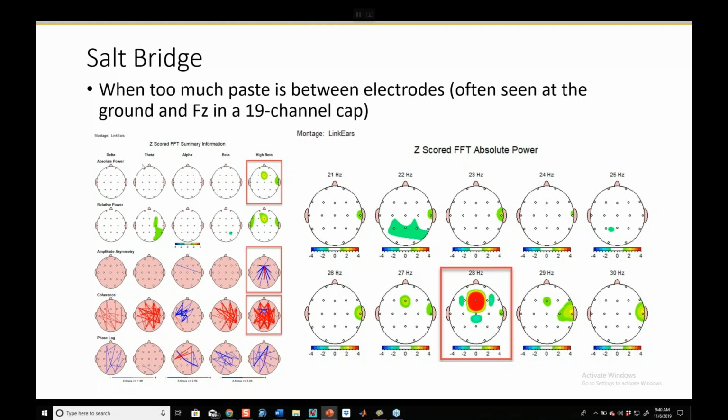In a spectra, it would not have what's called kurtosis. The spike that represents that 28 hertz at FZ, it wouldn't have sides. It would just kind of go bink, bink like a needle. And so this is not real.